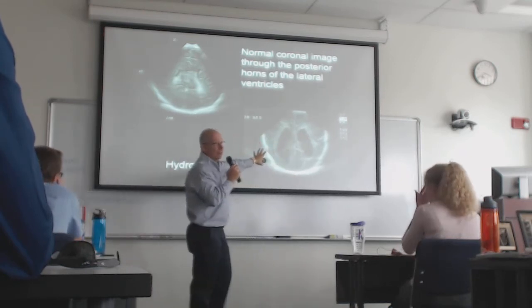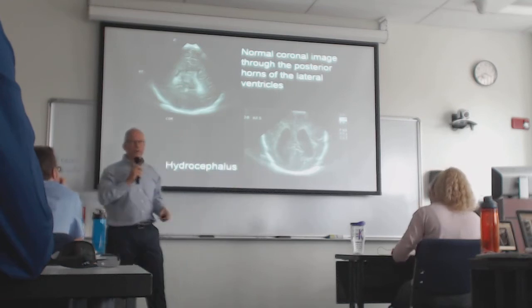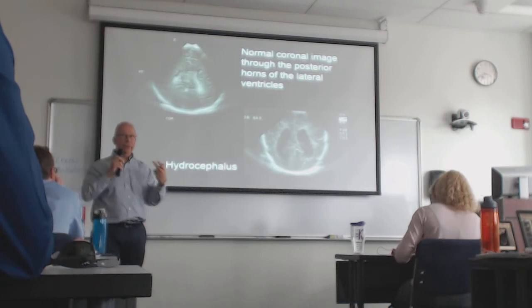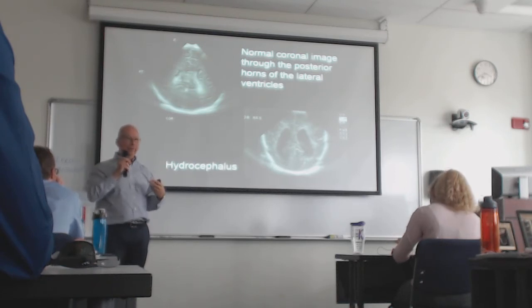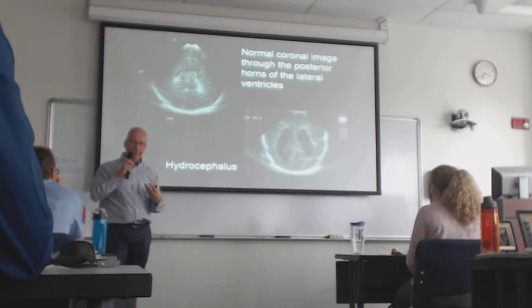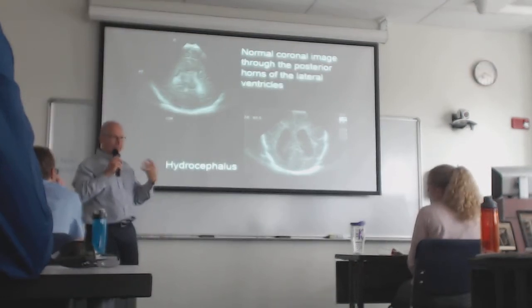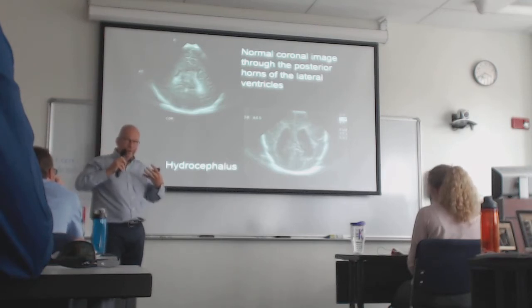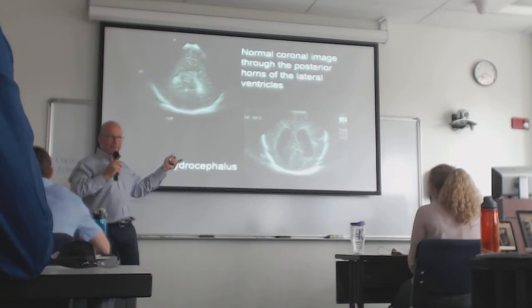There might be some old hemorrhage. Once you get hemorrhage in a ventricle, then the normal resorption mechanism doesn't work as well. The blood actually keeps the CSF from being resorbed, so even though the blood may start to disappear, the CSF keeps being produced and it doesn't get resorbed, so the ventricles get dilated. You put a shunt in these kids.